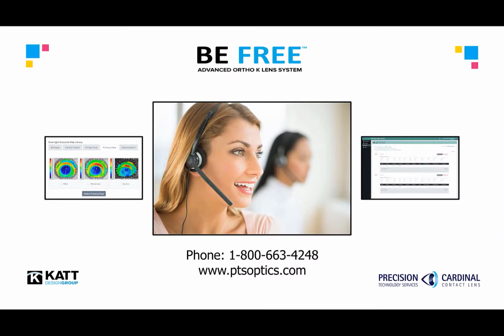Whether you have a linked topographer or not, the BE FREE software is a powerful tool to assist with lens design and fit optimization. It makes the complexity of Ortho K lens construction and modifications so simple that even a neophyte can produce outcomes equivalent to an expert. However, you also have support from the Precision and Cardinal consultation team. We are here to assist you through this entire process. Contact us at any point if we can help with processing or to answer questions. Thank you.